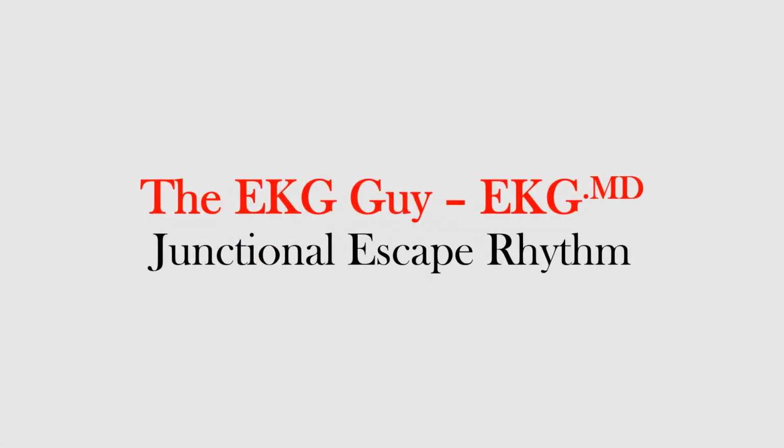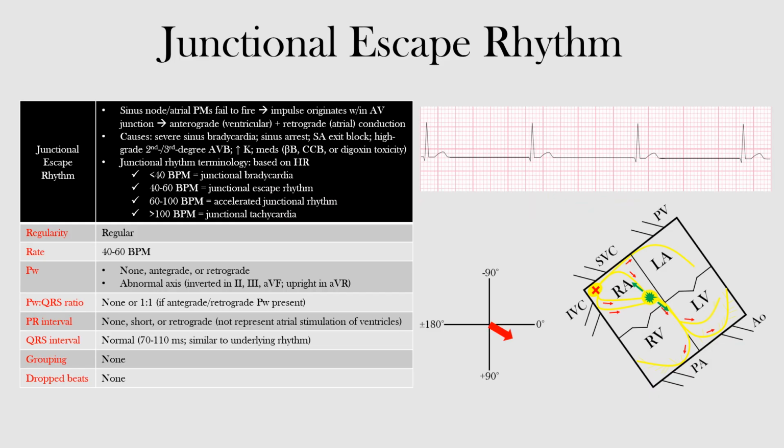In this lecture, we will discuss junctional escape rhythm, including its mechanism, potential causes, EKG features, and basic junctional rhythm terminology. A junctional escape rhythm, which is also referred to simply as a junctional rhythm, occurs when the normal pacemakers fail to fire, in this case the sinus node and atrial pacemakers, and then the next available pacemaker in the conduction system fires in its place.